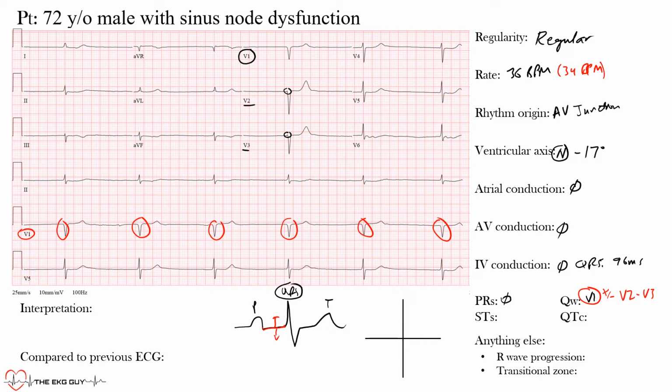All right, next we're looking at the ST segments. So the ST segment is this portion here from the end of our QRS complex up to the beginning of our T wave. Is there any elevation or depression, we're asking ourselves. In this case here, there's not much ST segment elevation or depression. Not something that I would certainly comment on. You see a little issue here at the end in the complexes, but nothing significant, and that isn't depression or elevation that's going on there.